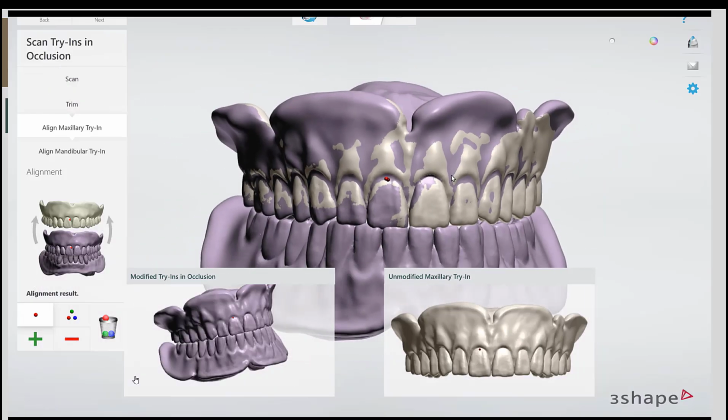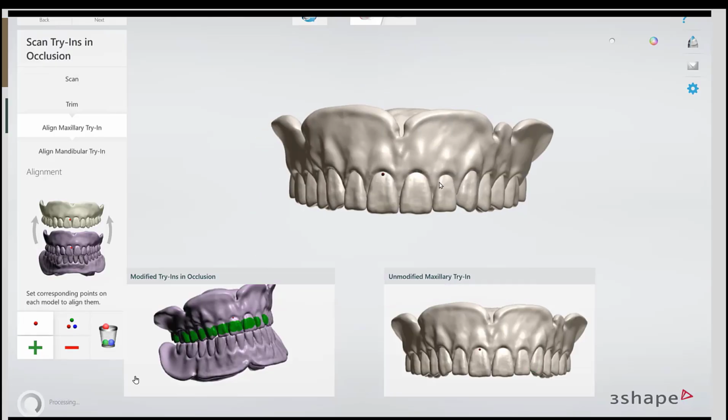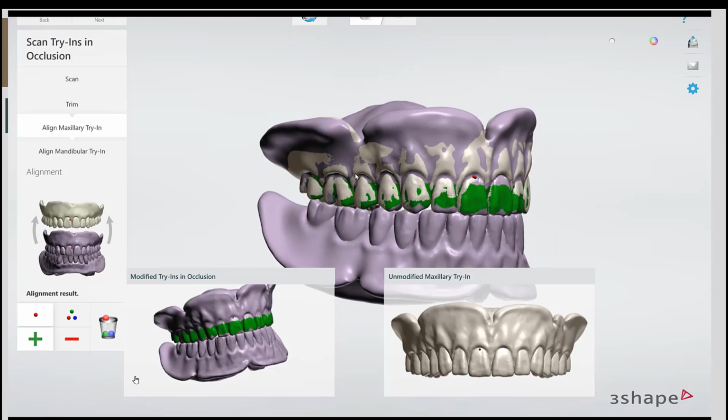Now this isn't necessary. This is again a little bit more complicated, but if you like thinking out of the box or you like seeing other ideas to tickle your brain with, this is just one more way to work around this.